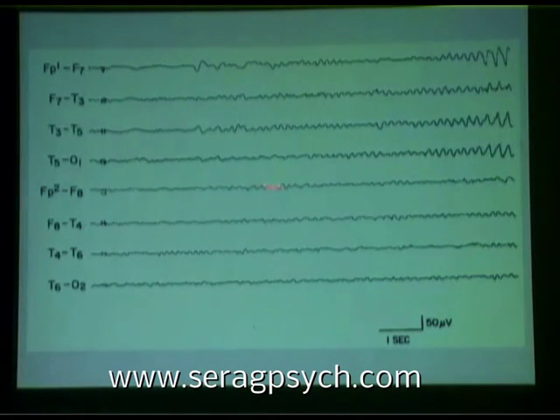So this is not a right temporal seizure. What's happening over here is only secondary to the left. So concentrate on here. What you have is FP1, F7, F7, T3, T3, T5. Not a very good looking spike, and maybe not even a spike. But anyway, suddenly you go from this kind of activity to this kind of activity. So something new that could not be explained by a change in state. So there's a change in the EEG. But then there's a change in the change. So you go from one thing to a second thing to a third thing, okay? So it's progressively evolving. You see that?